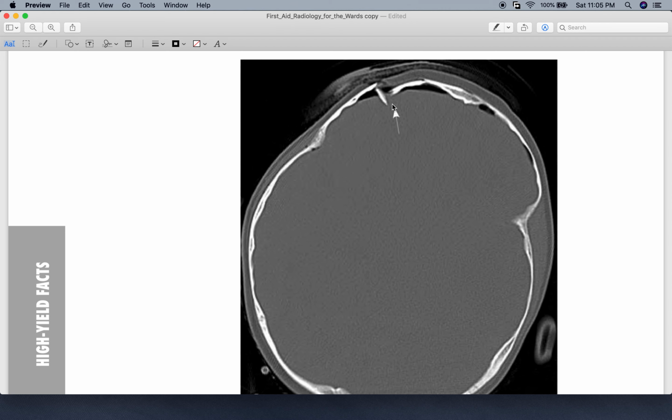But this is not the only thing that we can see here. We can see something else, and that is a hematoma. This black area is nothing but blood accumulating here, because it shows a black area while you can't see that in other areas, and this tells us how long it's been like that. I can tell that this is probably a subacute hemorrhage happening here. Anyway, we are going to talk about this in a moment.